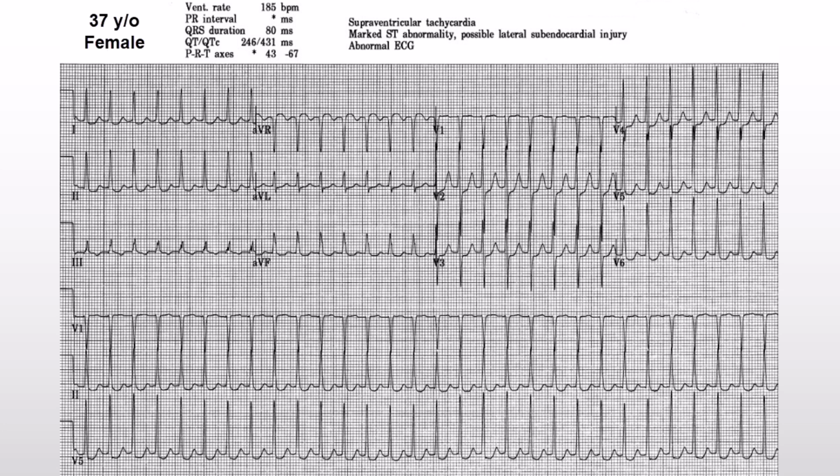Now, let's look at the QRS intervals. That's the official term for a QRS complex, but QRS complex is quite acceptable. I say it all the time. So the QRS complexes are all very narrow. The machine says 80 milliseconds, and that's quite plausible.